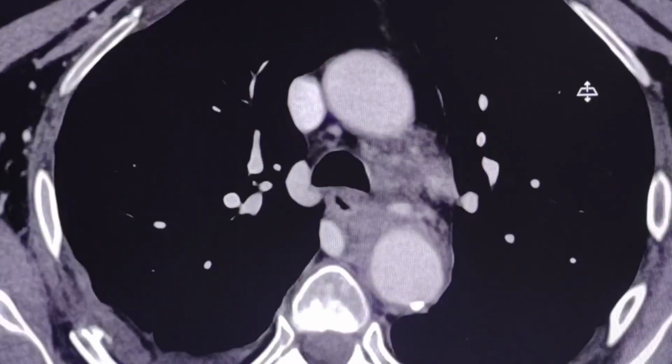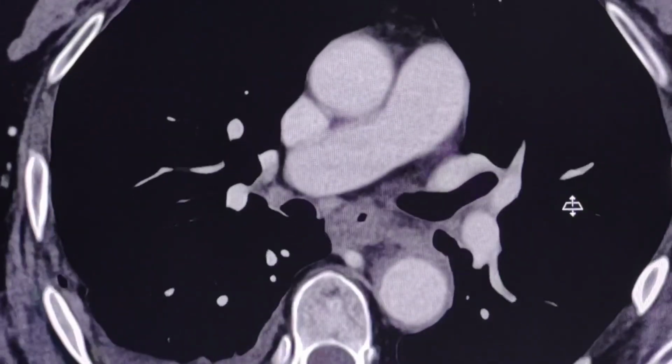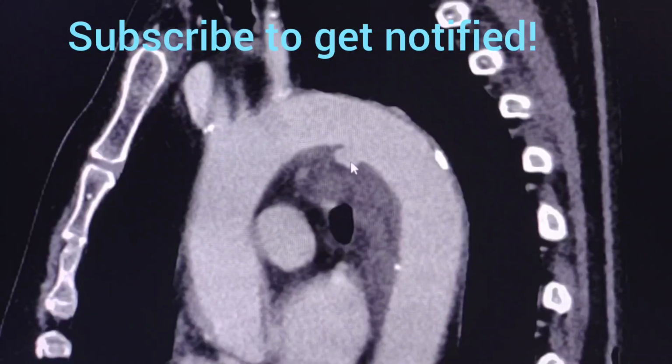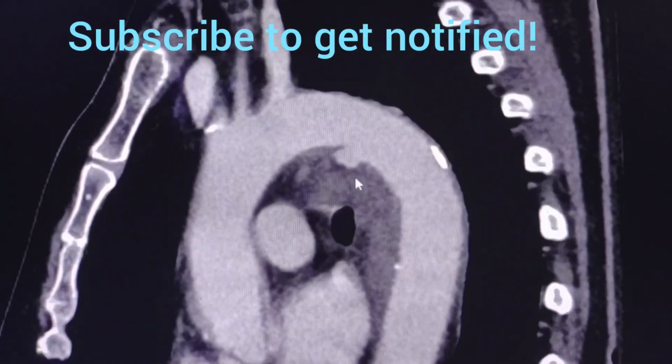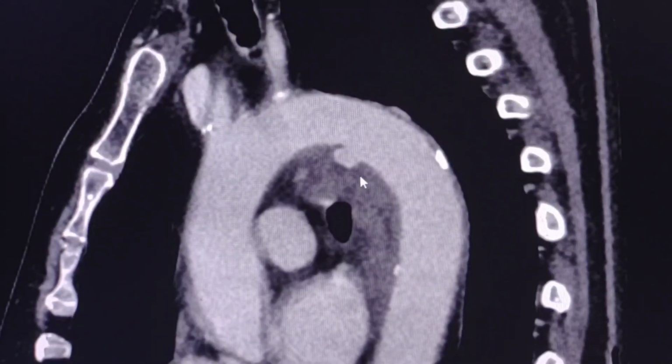So in this case, we have a small amount of bleed, of hemorrhage around the vessel, around the aorta, and there is also a pseudoaneurysm. So this case is a partial transection and a pseudoaneurysm, or pseudoaneurysm and injuries to the outermost layer of the aortic arch, the adventitia.